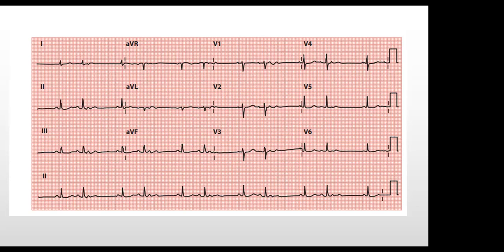So I will be thinking of premature atrial complex in bigeminy.